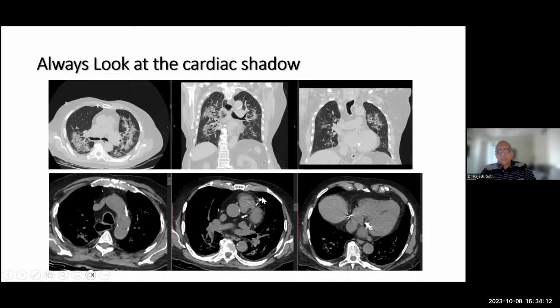So this is where we are. CABG was done and consolidation because of pulmonary edema, dilated esophagus possibly adding to the pulmonary edema findings, and you can see the infarct over here in the interventricular septum. A chronic infarct looks hypodense and can be easily picked up even in an NCCT. So this is what this patient had. You can see the coronary artery disease with evidence of a clip over there.